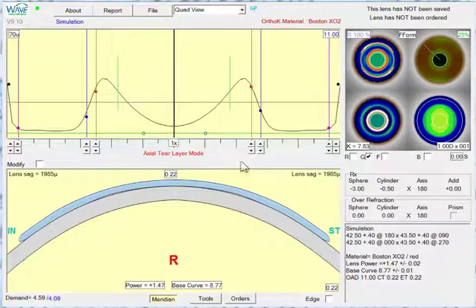And now you've got an RSIM lens, but in GSIM mode, and the reason for that is we're just doing a simulation, so this fit will really be like a trial lens fit. You have to really look at the fluorescein patterns and then look at your post-treatment topographies.